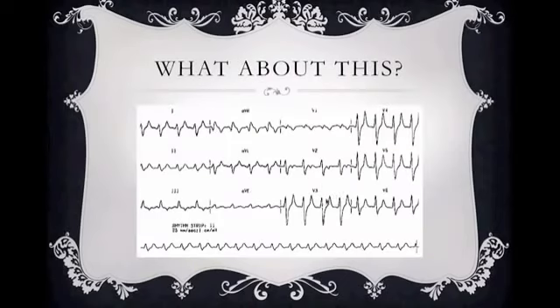All right, what do I got? I got a symmetrical T wave, peaked. Here you can see it really good in V4. Symmetrical T wave and peaked. All right. That is another classic hyperkalemic T wave.